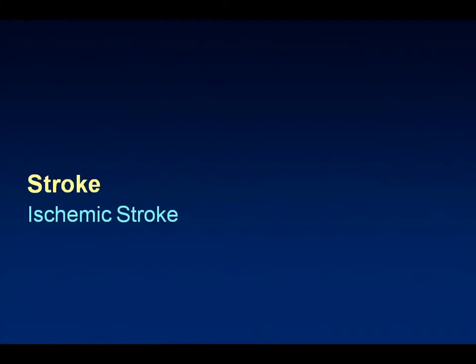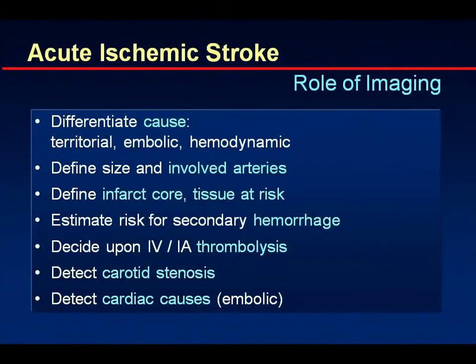Now let's focus on ischemic stroke because this is the area where there is the most things going on and that is the most dynamic and where we can contribute to appropriate treatment. What we would like to differentiate here is, of course, the cause, whether it's a territorial, an embolic, or a hemodynamic stroke. That is not always possible, but very frequently.